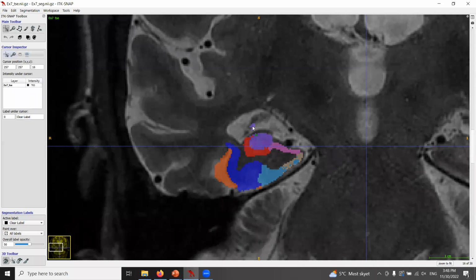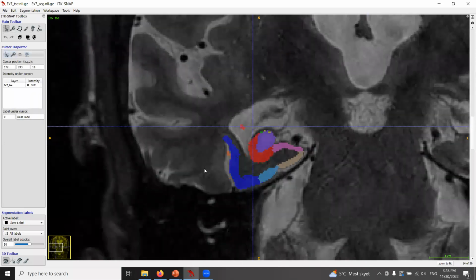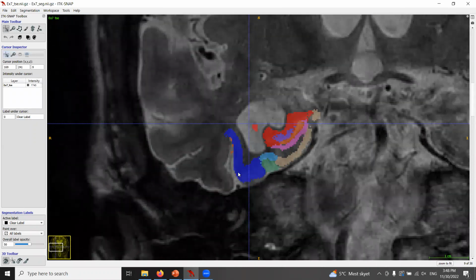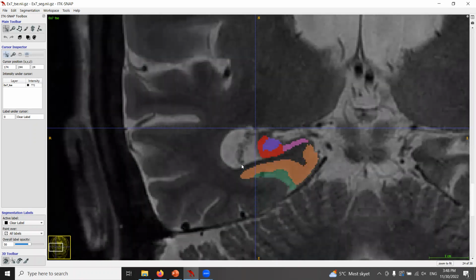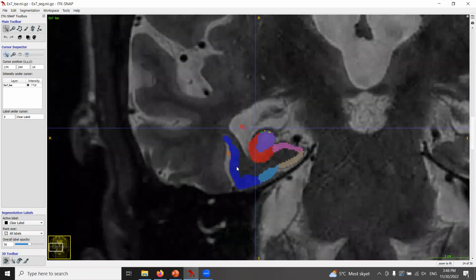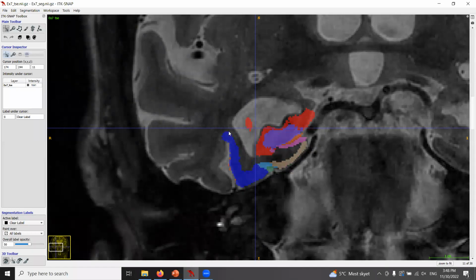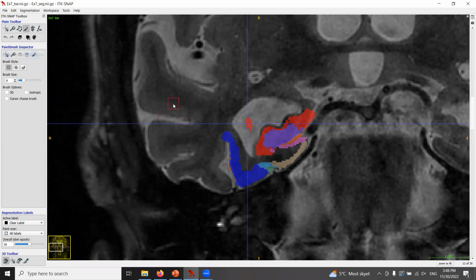So here, this label is incorrect. And I see one here, so that would be a second slice, and 3 and 4. So I see some scattered voxels in 4 slices. I have to say this is a little bit of a borderline case for me, but since this cluster of voxels is a little bit bigger, I would say maybe either exclude or edit. And to be honest, I think I would just edit just because it's so easy to do.